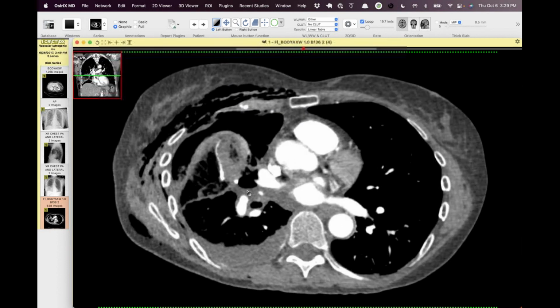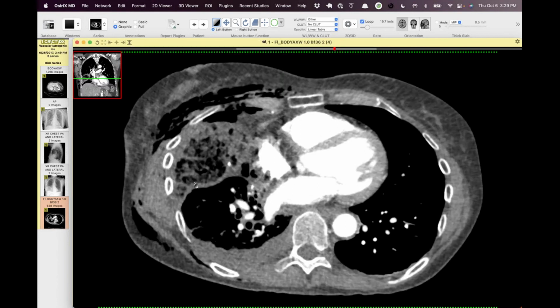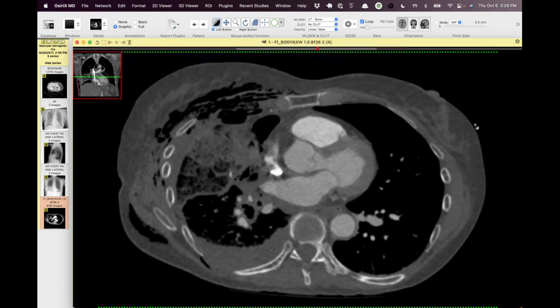Probably from the venous infarction. Probably getting venous congestion, yeah. Some perfusion is getting through, but nothing can get out. But yeah, this is non-enhancing lung. There's no atelectasis to contrast, like in that pulmonary embolism and infarct case. But whenever you see lung like this, you have to think about some sort of infarct or venous congestion.